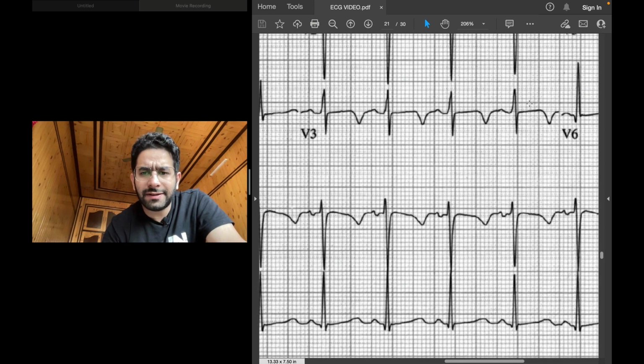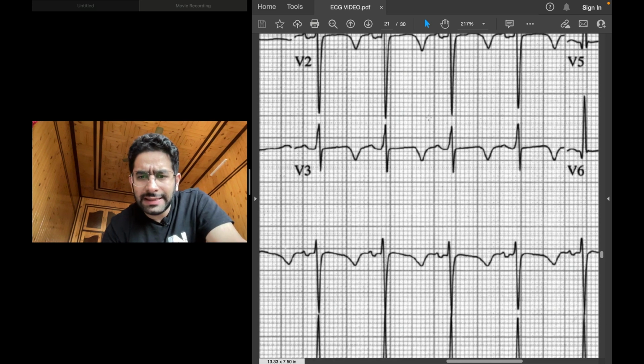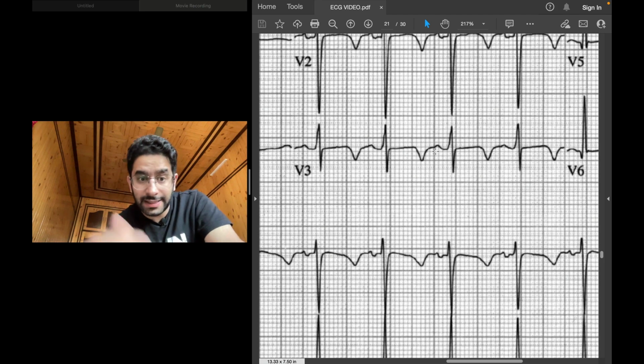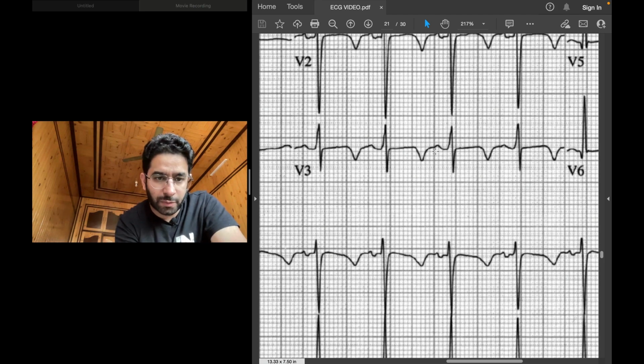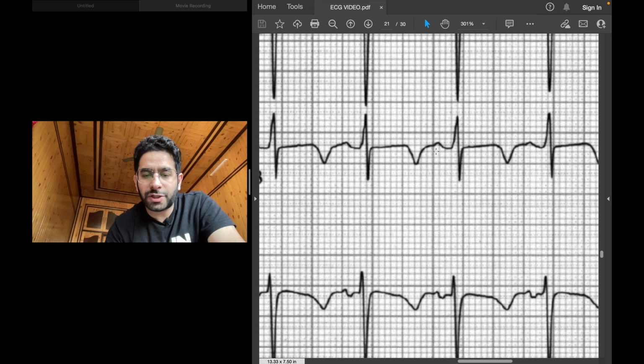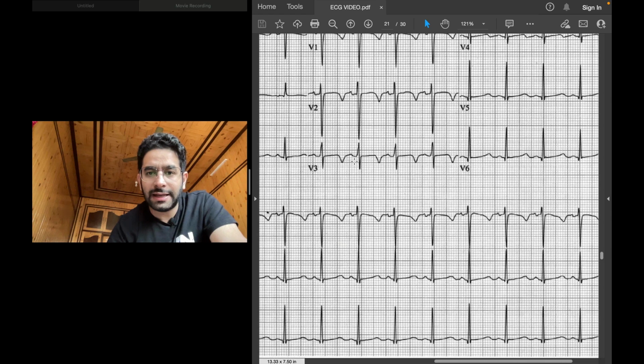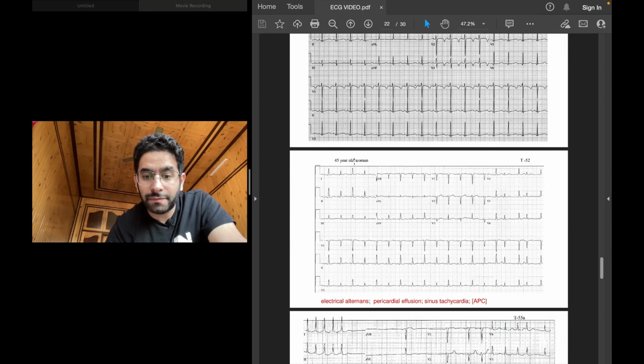There's also a rule of thumb: if you consider a midline between the RR interval, and the T wave is extending beyond that midline towards the next QRS, likely the QT interval is prolonged. Here you can appreciate by that rule, this T wave is a lot away from the QRS complex. This is a clear-cut prolonged QT interval in a patient with hypocalcemia.